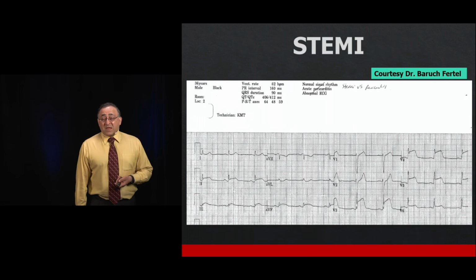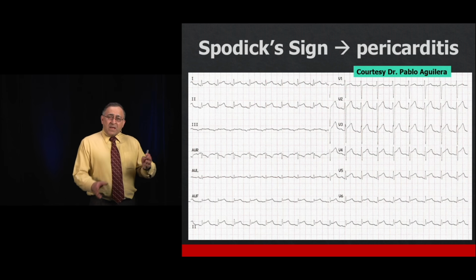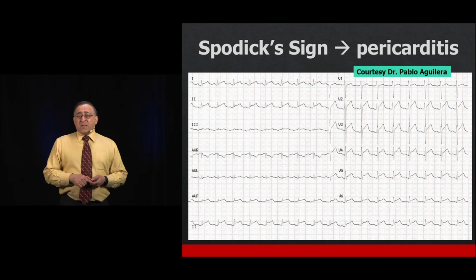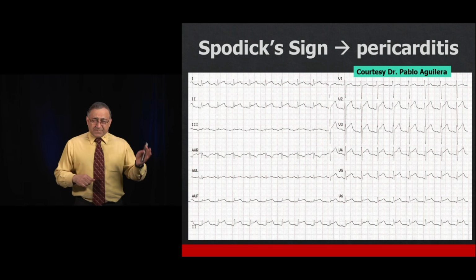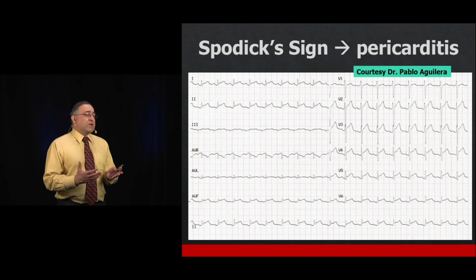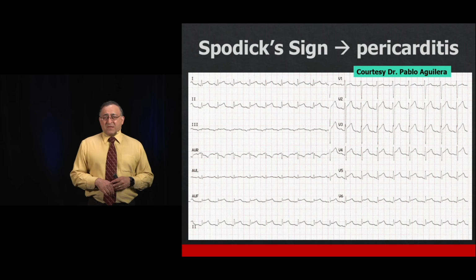So this turned out to be a STEMI despite the computer trying to fool you. This was definitely a STEMI. Now, what is this Spodick sign? Many of you have probably heard of Spodick sign before. This was first described by David Spodick, who's a cardiologist. He passed away several years ago, but he did a lot of really great research and teaching about pericarditis over the past few decades.